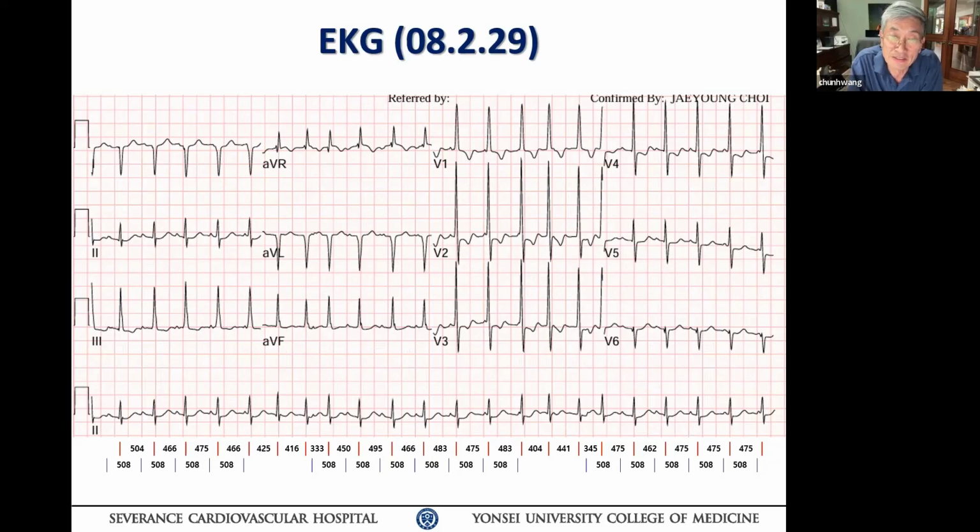It's very unlikely. I have not seen severe COPD, cor pulmonale patients develop that kind of pattern without right bundle branch block. Often they also have anterior fascicular block together, making an even more bizarre axis. But this QRS is too narrow. This has got to be coming from a very proximal bundle.